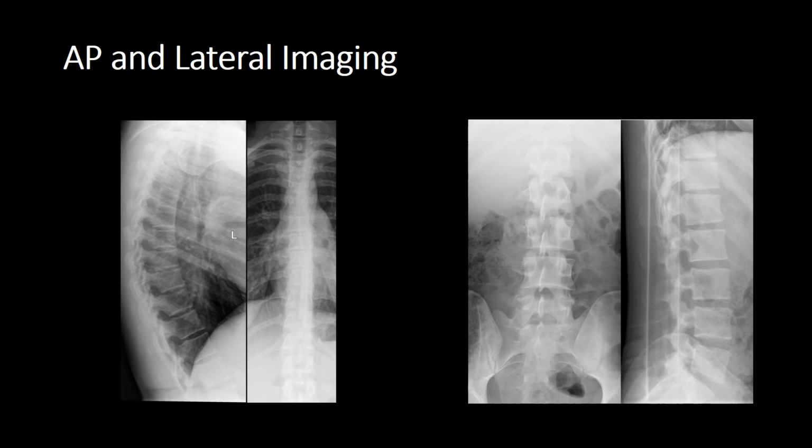Look at every single pedicle. Can you see them all? Look at your spinous processes. They should run down the midline. Although having said that, the majority of adults have a very slight mid-thoracic scoliosis, convex to the side of their dominant hand due to their muscles being stronger on that side. But like the cervical spine, the key thing about the spinous processes is looking at the interspinous distance, and is that equidistant as you work your way down. If you have diastasis, that will indicate that you've got an abnormality to the posterior elements.